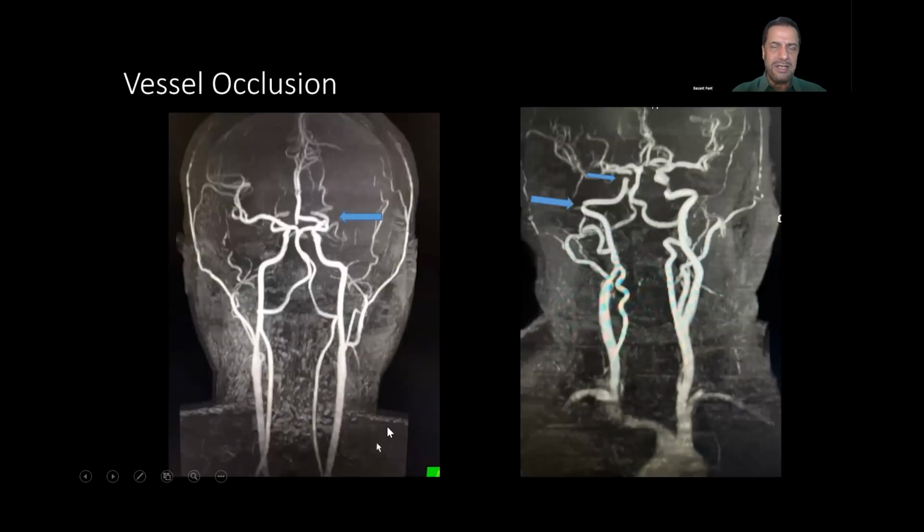There are some examples of vascular lesions. You can do an MR angiography, even without a contrast, and get a very nice image like this. I will not go into detail of angiography here; I will talk about it in another video. Before that, you may have to see what a normal brain looks like, where I have talked about MRI of the normal brain.